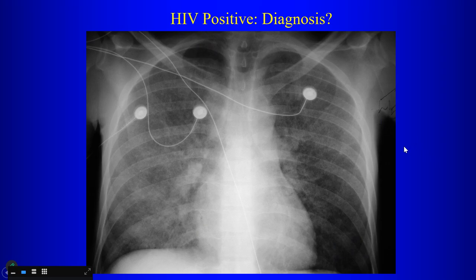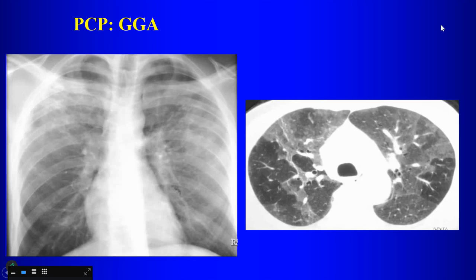Okay, here's a patient who's HIV positive. What do we see on the chest radiograph? Well, there are consolidations, right? So we have bilateral consolidations. You talked about what this could be: pneumonia, pulmonary edema, if there's a reason for that. In addition to bacterial pneumonias, we said we also consider viral pneumonias, right? Which can also do that.